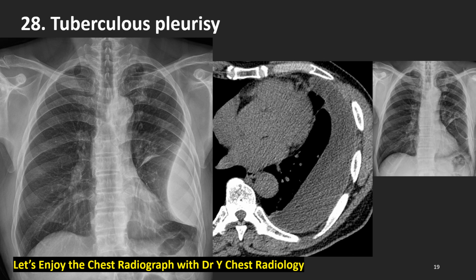We confirmed tuberculous pleural effusion of lentiform or crescent-shaped pleural effusion here in non-contrast enhanced axial CT. After drainage, the pleural fluid has gone.